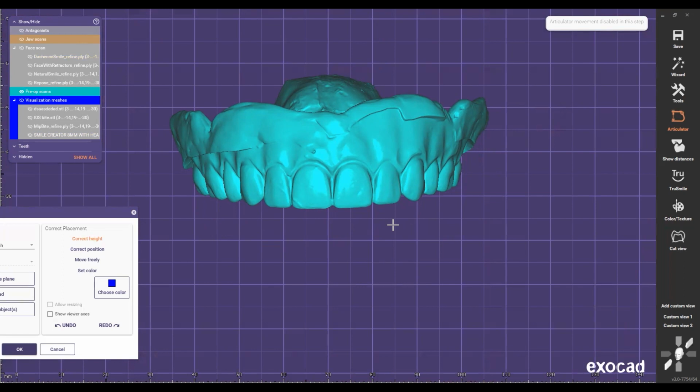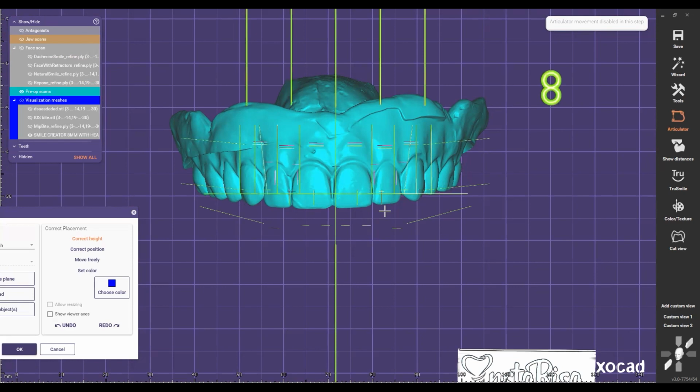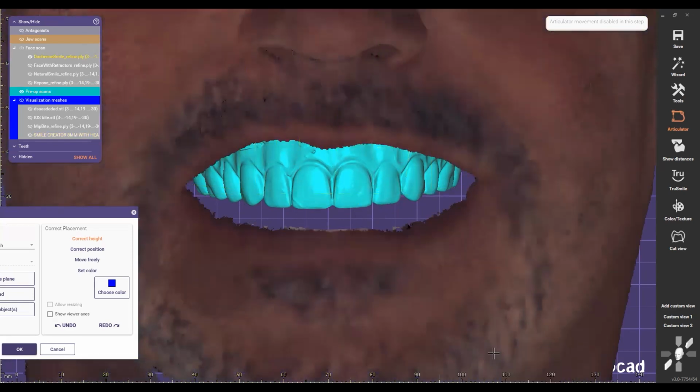And we go, okay, let's do it, let's follow. And then we start putting the teeth following this denture. And then the patient is not happy. The patient says the teeth are too long, and we don't know what's going on. We don't know why. And here I just did this and I know why: these teeth were too long because they were not properly set in the face. They were just set up in a stone model, and that's it, hoping that it's going to look good in the mouth, but I can see right away that it doesn't look good. But having the facial scan, we can nail any case.